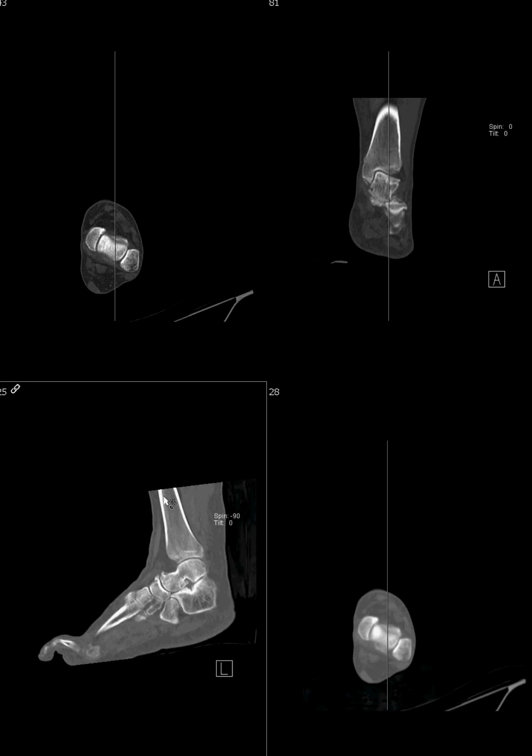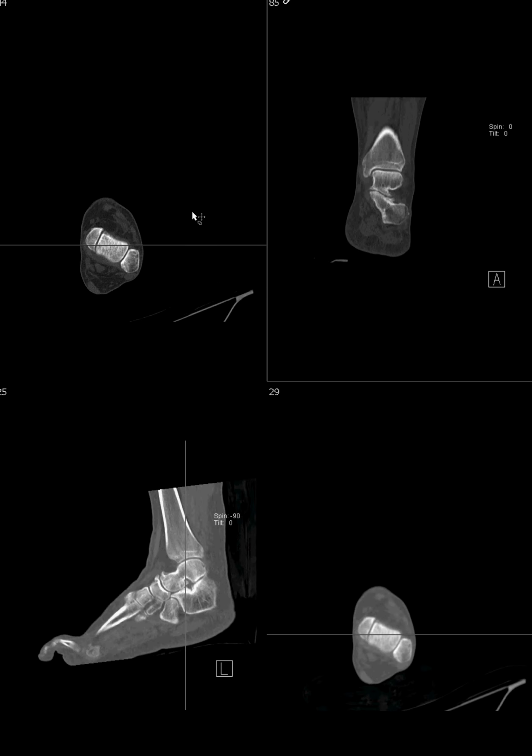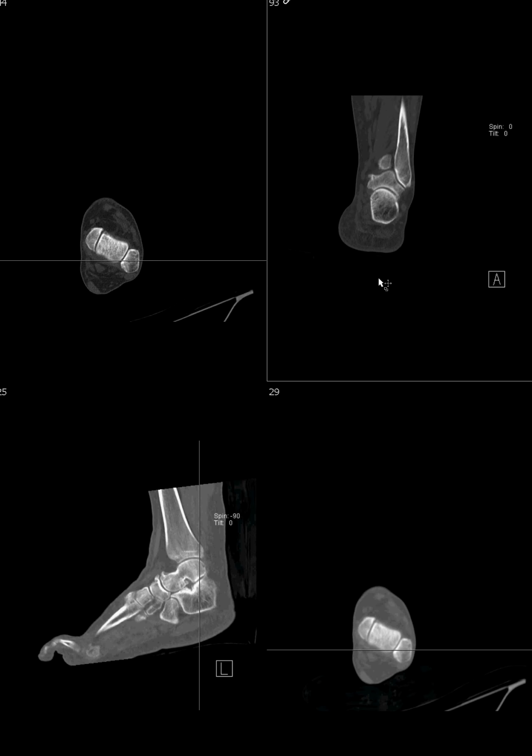And typically we would cover the midfoot as well, just to make sure that we're covering what we need to. But because the ankle is requested, the anatomic plane of the ankle can be looked at on axial images between the malleoli, that is between the medial malleolus here and the lateral malleolus here. And we want to orient our image planes according to that.